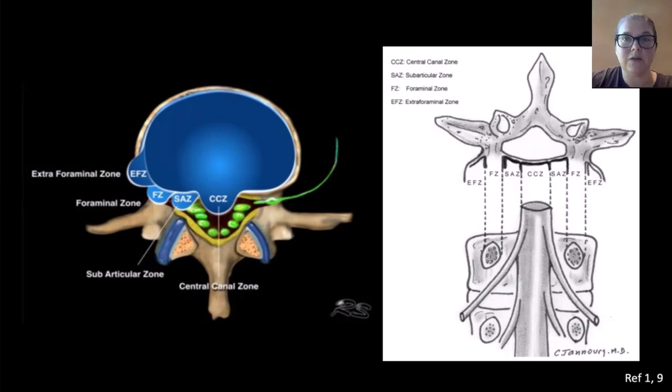Disc bulges, I will say, again, if it's asymmetric, imagine that this was one big bulge, so not 4 different herniations. I would say there's an asymmetric disc bulge larger from the central to right extraforaminal zone, something like that.